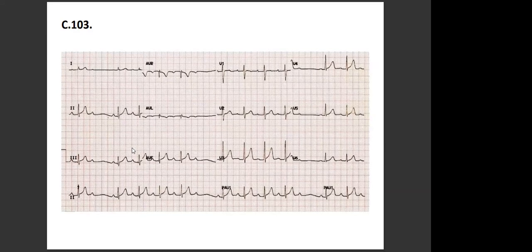For 103, I can say it's a normal rhythm. Well, I don't think that's a normal rhythm. It's really hard to say whether it's normal or not. So this is not a normal rhythm. Good. And it has 75 beats per minute, the average rate, because this is arrhythmic. So arrhythmic, normal heart rate, and the axis is normal as well, close to 60 degrees.